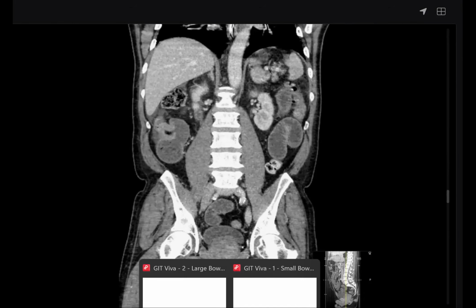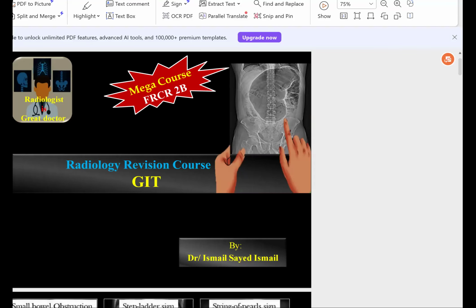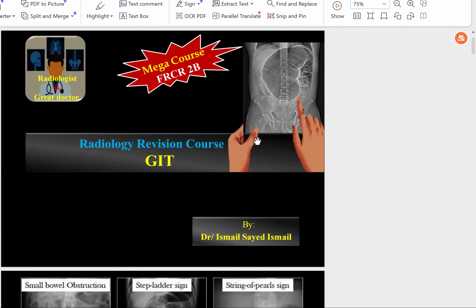Excellent. Thank you. I'll just spend a few minutes to revise the approach to small bowel dilatation. First, if you notice a dilated stomach and or duodenum, think of gastric outlet obstruction or duodenal causes. If you notice large bowel obstruction, think of large bowel causes, especially cancer, or a specific type, for example sigmoid or cecal volvulus, from the radiograph or from the scanogram.